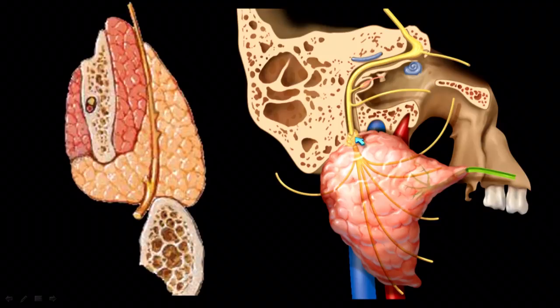So at the stylomastoid foramen, again, just like all those other cranial nerves, we look for a good fat pad at that location. We want to see nice fat below every foramen of the skull base. It pierces the back fascia of the parotid, and then it splits in that pes anserinus. All those branches, temporal, zygomatic, mandibular, buccal, cervical, all of those branches that extend out over the face.